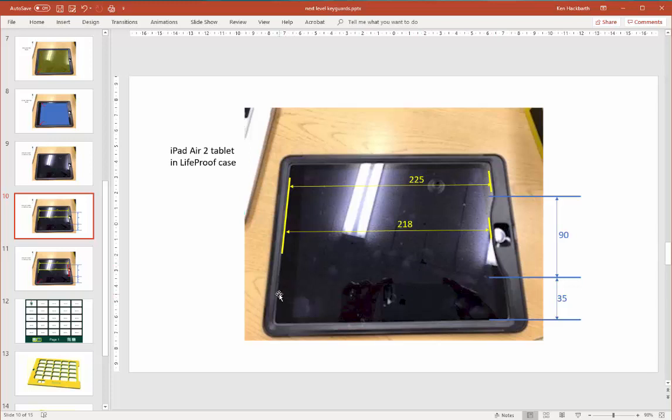That's the border of the tablet outside of the screen region, and it's larger on this side than it is on this side. And you can account for that in the standard grid-based stuff under special actions. There are some options you can set for ensuring that your grid area is kind of pushed to the right to account for the fact that it's bigger here.